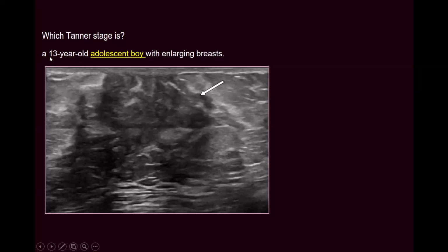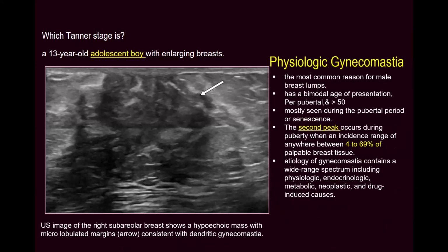Can you read the clinical history first? Yes, abnormal. A boy. Why? Gynecomastia, in a boy. This is physiological gynecomastia. Tricky, so tricky. We should always consider the clinical. Since the introductory lectures, we are repeating: correlate all breast imaging, but we have to go back and correlate with the clinical. Always we have to consider the clinical.